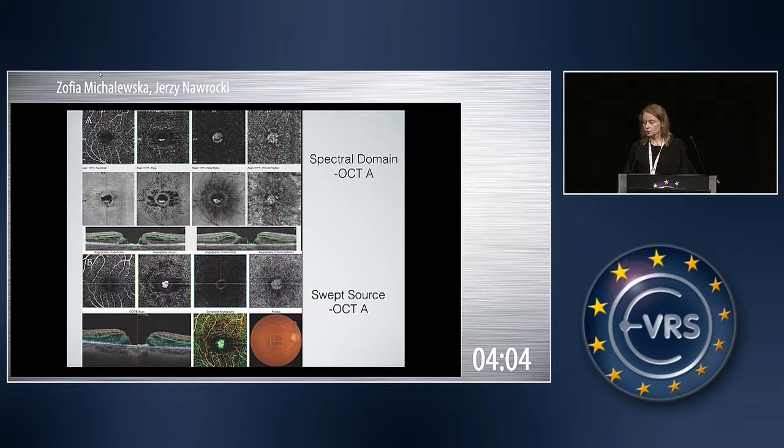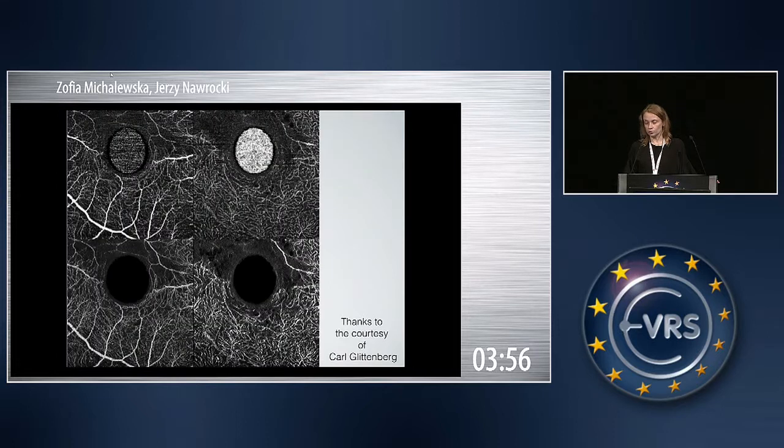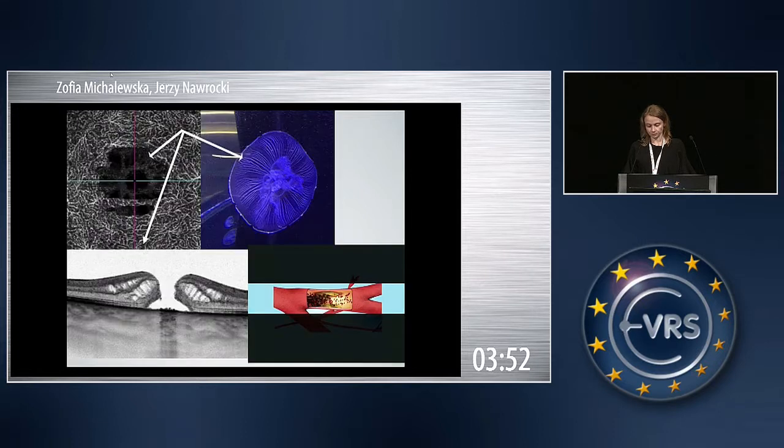So this segmentation error occurs in all macular holes in spectral domain OCT and also in Swept Source OCT angiography. It can be removed by external software, as you can see here, like Adobe Photoshop. Another artifact visible in full-thickness macular holes is the jellyfish-like artifact.